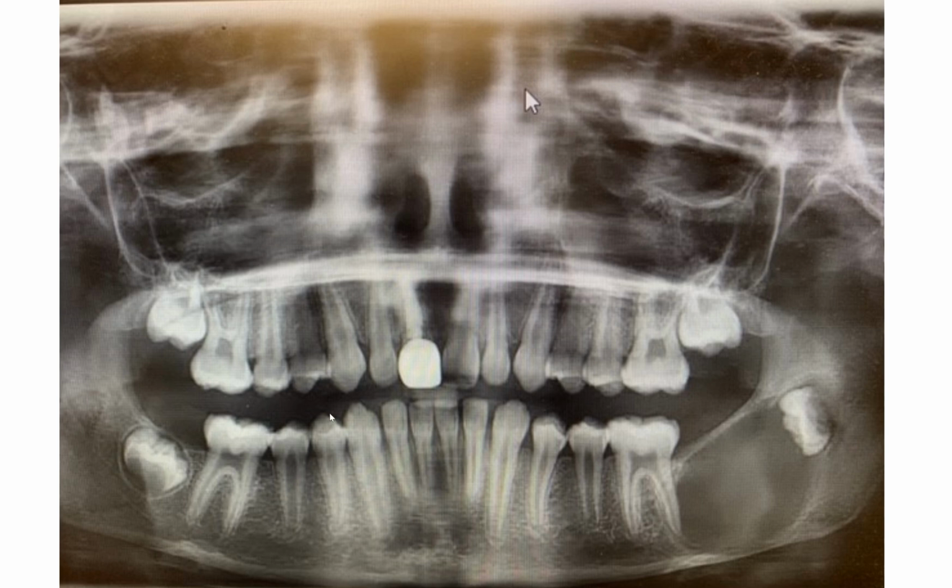What I found interesting is that had I only seen this radiograph, the second set of images, I would have probably considered dentigerous cyst as my number one differential versus the odontogenic keratocyst, just because of its pericoronal radiolucency and the prevalence. Obviously, when I consider all of these factors, also keep in mind this patient is only 12 years of age, or at the time of the first radiograph only 10 years of age. Now I think I would have strongly considered dentigerous cyst just based on this radiograph.